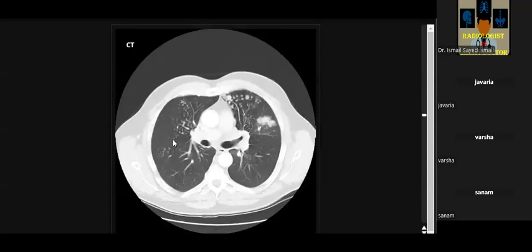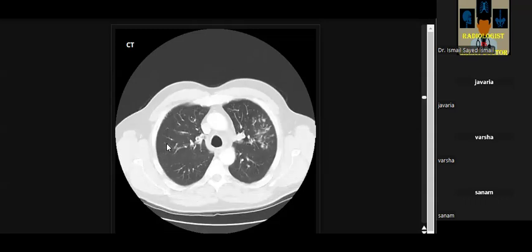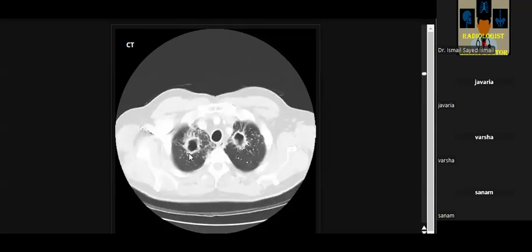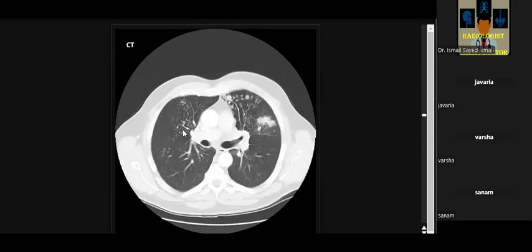If you put a possibility of tuberculosis, there are two important points that carry high risk. One of them is endobronchial spread of the disease process, tree-in-bud, which is of high emergency. And the other one is cavitation. Cavitary TB, and the tree-in-bud nodules, both carry high infectivity.